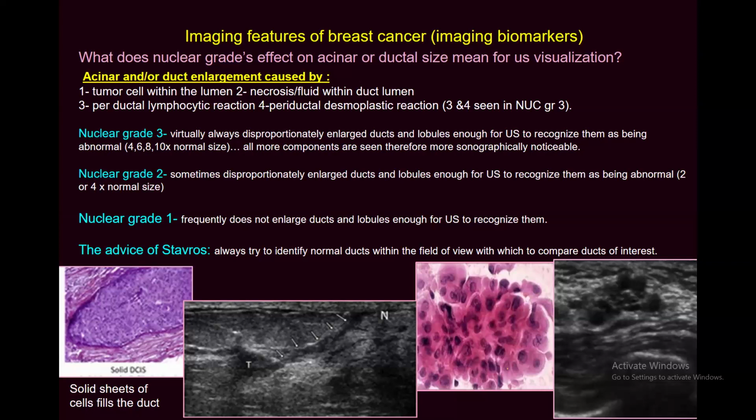Yes. And this explains the visualization on ultrasound. The more visualized on ultrasound, the higher the grade. You see? Since the high grades are significantly distended, we can visualize them on ultrasound.